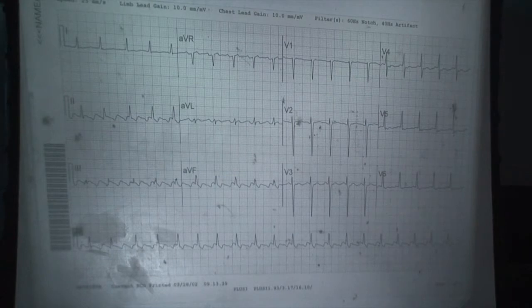It's tachy, first off. Right. It's okay, but it's not only tachy, it's a regular tachycardia. Right. And it's a relatively narrow complex. What causes a regular tachycardia? What can you immediately eliminate? Atrial fibrillation. Right, it's not atrial fibrillation.